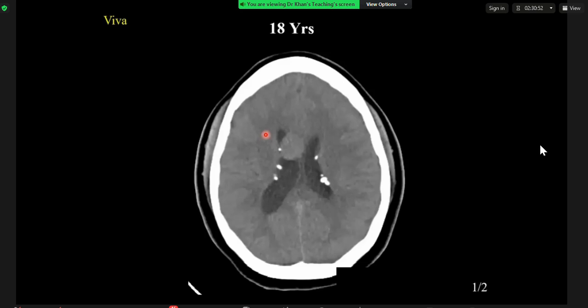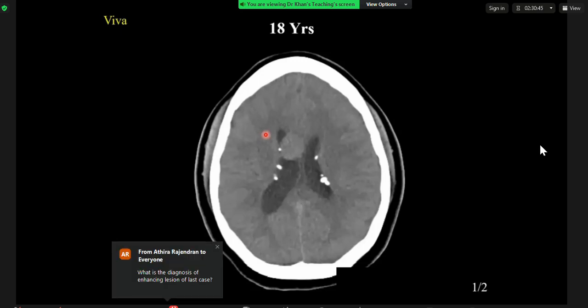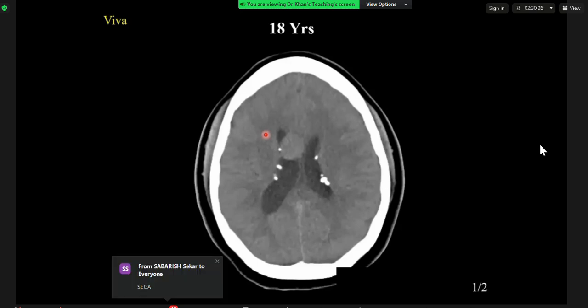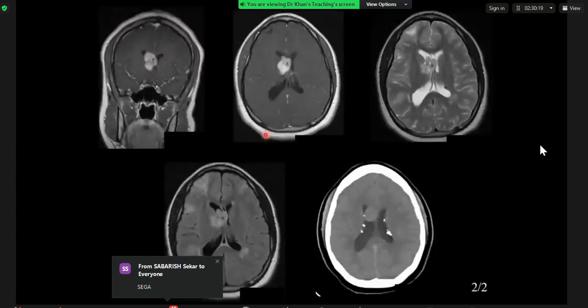But from the appearance of this lateral ventricle, I'm wondering whether these are calcified subependymal nodules, and this large lesion arising from the subependymal surface of the right lateral ventricle looks quite aggressive. It's not calcified. So this could again represent a subependymal giant cell astrocytoma in an atypical location rather than at the foramen of Monro.